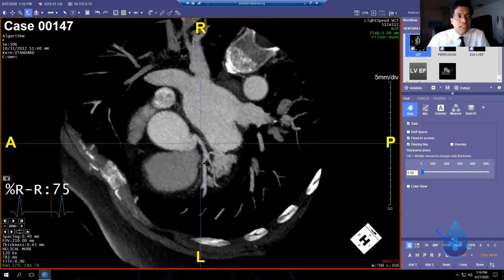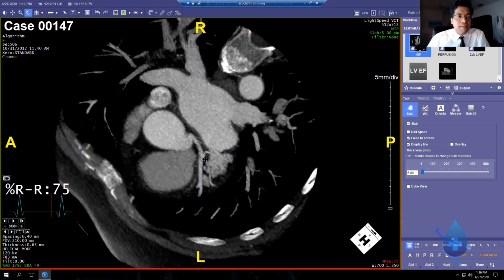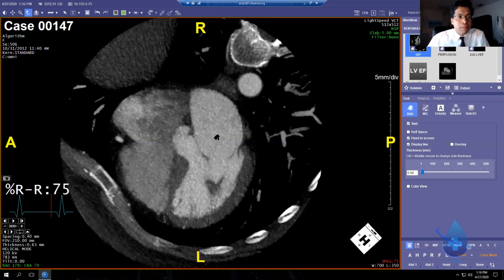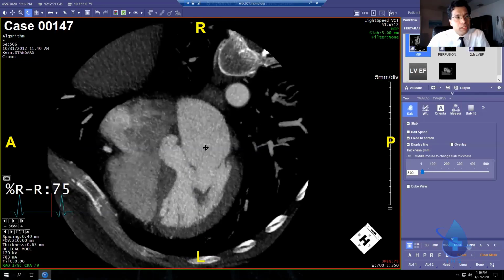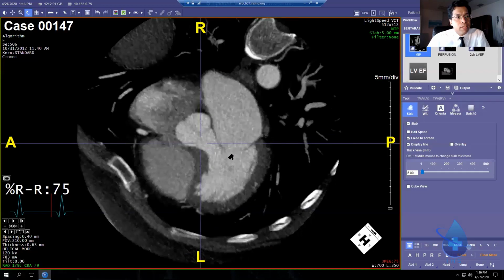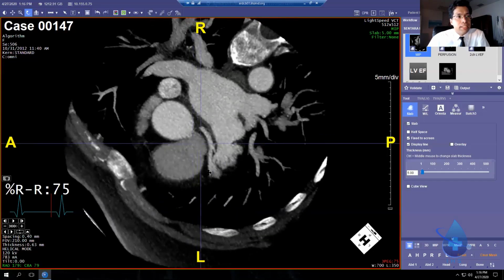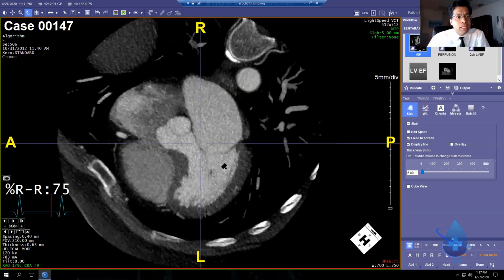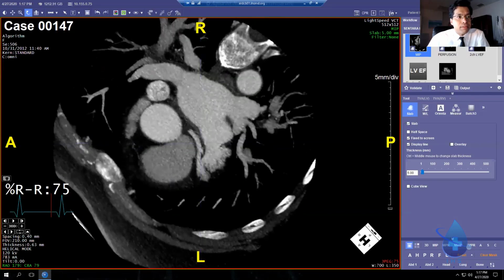Basically, what I have just done is give myself a 4-chamber view. So if I cut in to the screen, I'll be looking at more or less a 4-chamber view, okay? It's a little bit foreshortened. That's okay. Cut back to the surface, LAD, because the LAD follows the septum. Not perfectly, but pretty close, okay?